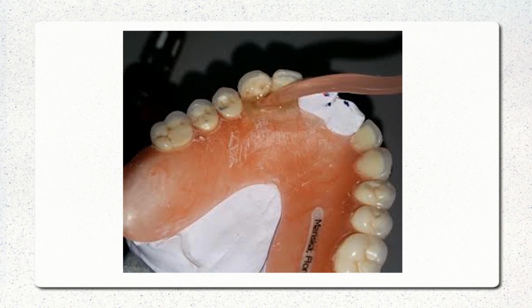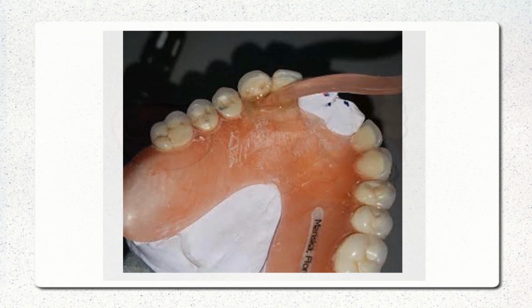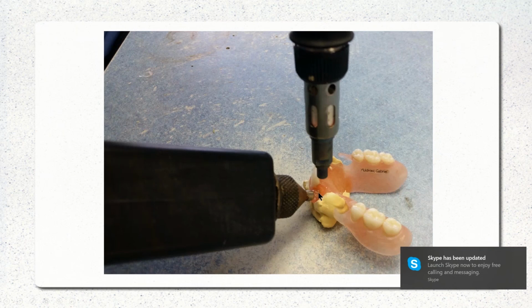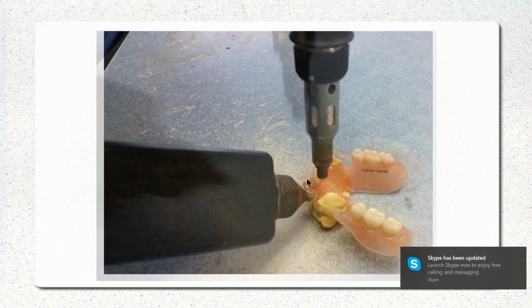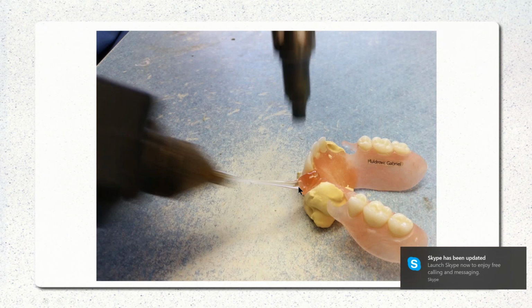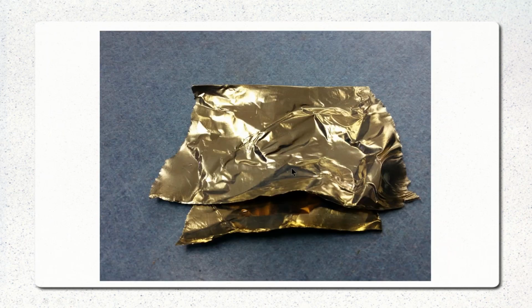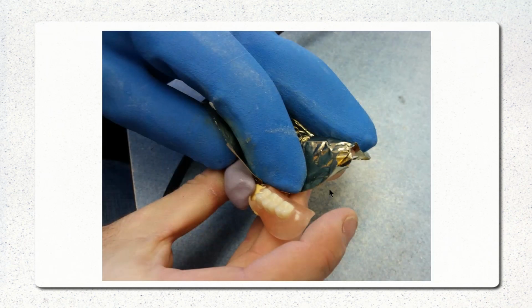All right, another one, adding the tooth. All right, this one, heat here, inject a blob. More than what you expect to need. Smush your putty into place. You're going to have that blob of material come out the lingual. Use your aluminum foil, works just beautiful. Wrap it around your finger and just kind of smush that back in. It won't stick to the aluminum foil, so that's why we use it. And there's the lingual, ready for cleaning up and polishing.